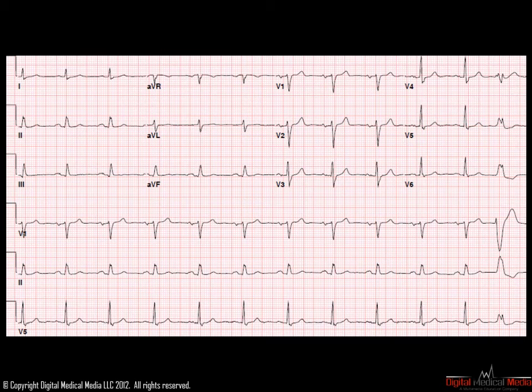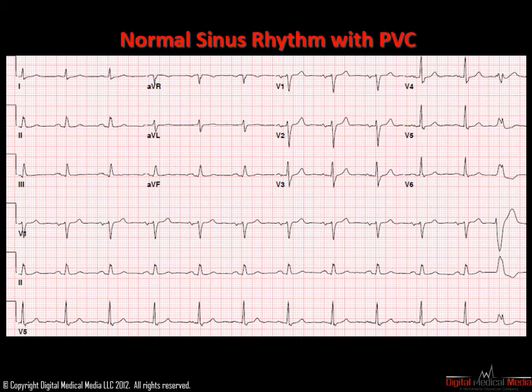If we look in front of the QRS, a PAC should have a P wave in front of it, but a different shaped P wave than those present in front of all of the other QRSs. There is no apparent P wave in front of this QRS. That, combined with the wide nature and unusual morphology for this beat, confirm that this is a premature ventricular contraction. The ventricles have fired early and out of sequence. This appearance is normal and not a cause for concern in any way. The correct interpretation of this ECG would be normal sinus rhythm with a PVC.